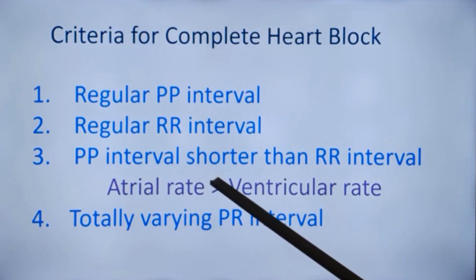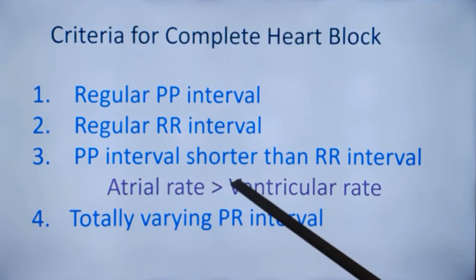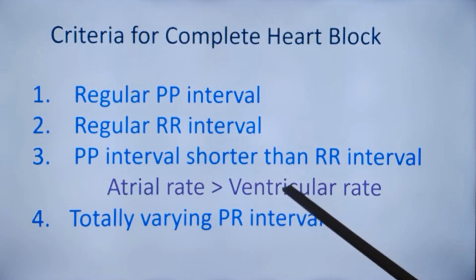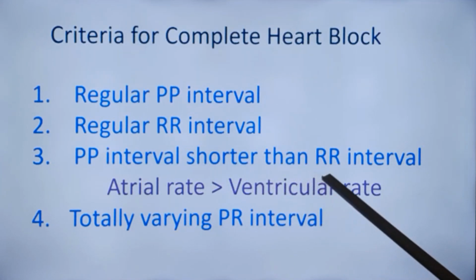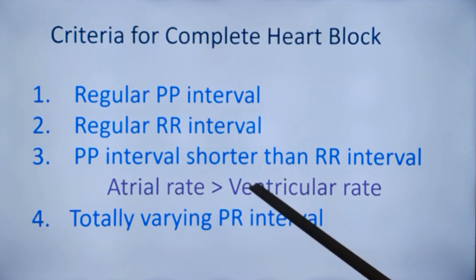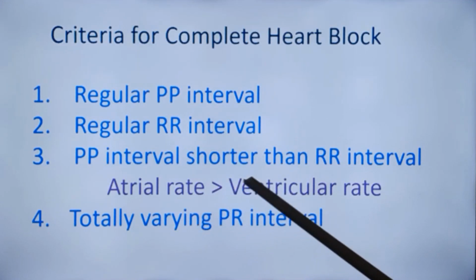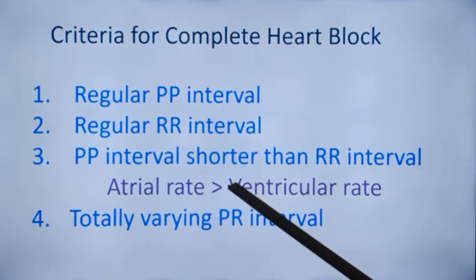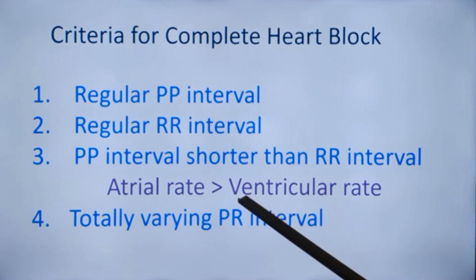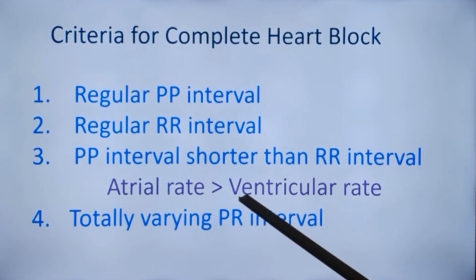Then there is also another condition in which there could be AV dissociation with this narrow QRS rate more than the atrial rate. That is junctional ectopic tachycardia, where you can have AV dissociation. Junctional ectopic tachycardia with AV dissociation is another possibility.